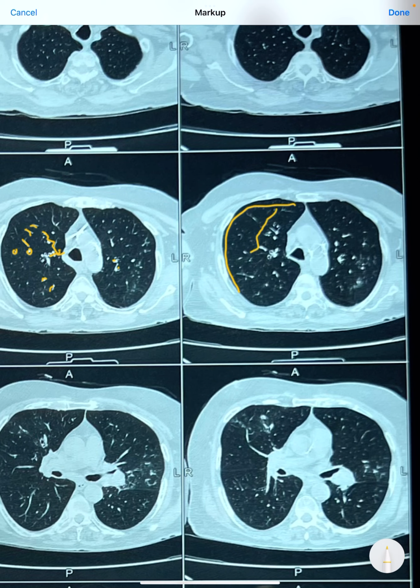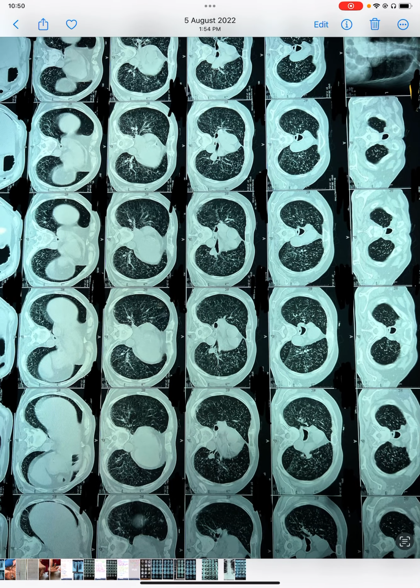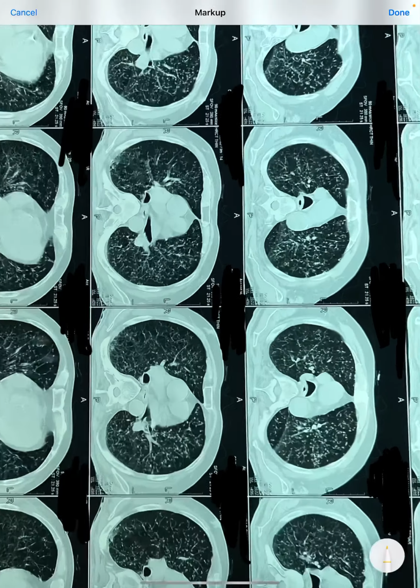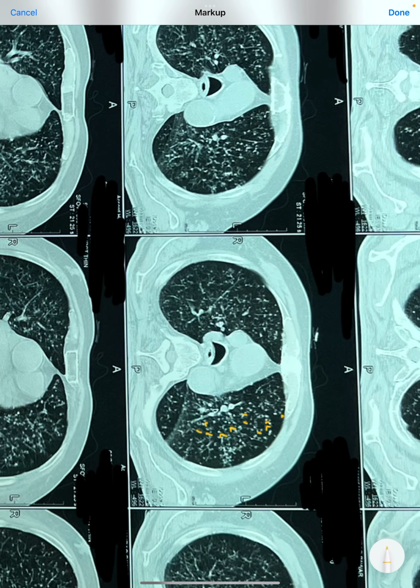In the periphery, there is no miliary mottling, but in this scan we can very nicely make out that there is an extensive starry sky appearance. There are so many small millet-sized, millet-shaped structures. This is a very typical HRCT finding of miliary tuberculosis.